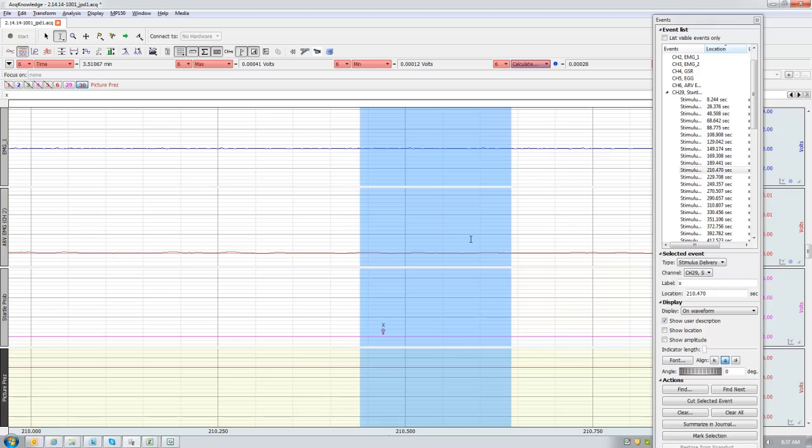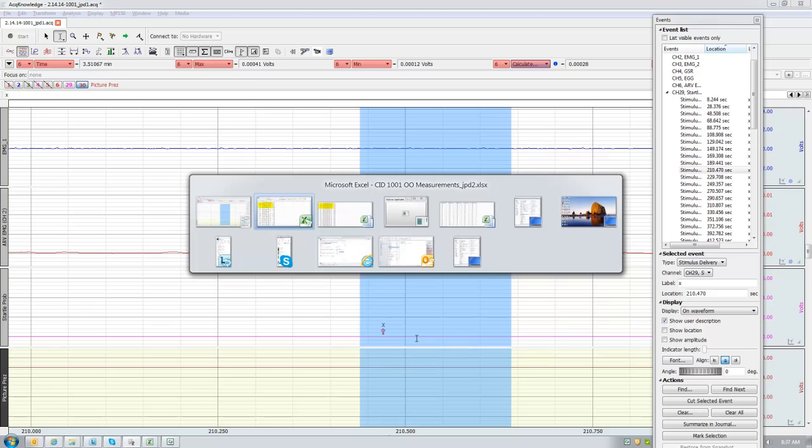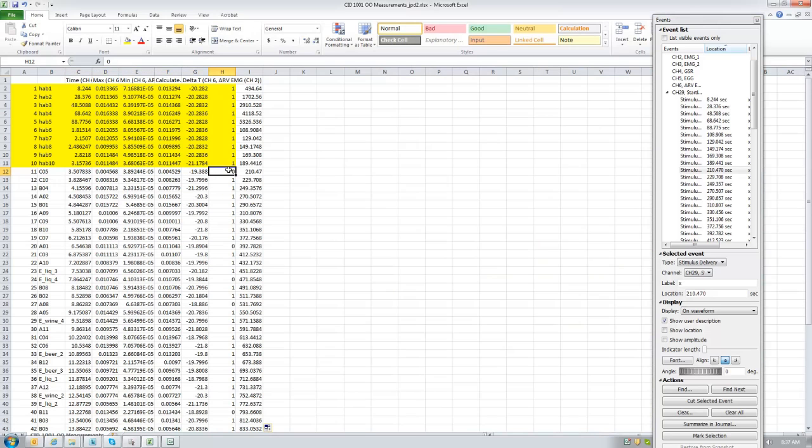So this is the first deviation that you might see when you're looking at your trials. This just means no startle probe was administered. You may see some natural blinks here, but if you don't see a probe being administered, if this is flat, that means there was no startle probe given to the participant, and again that would be indicated by a 0 right next to our trial.